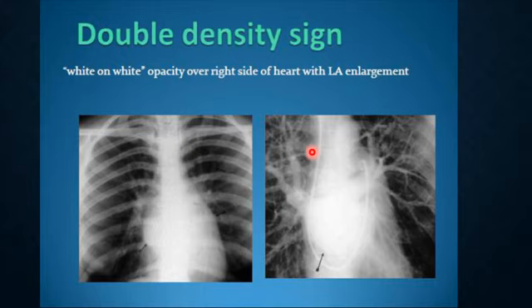With this pulmonary angiogram, you can see the catheter is just making a loop due to the presence of a big left atrium here. Okay? You can see there is something here behind the heart. It's the left atrium. Okay?